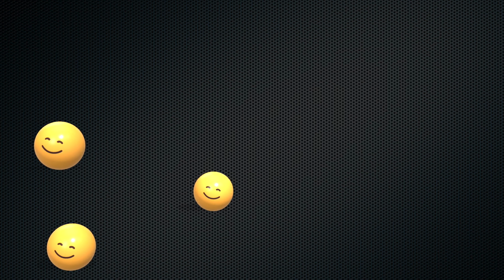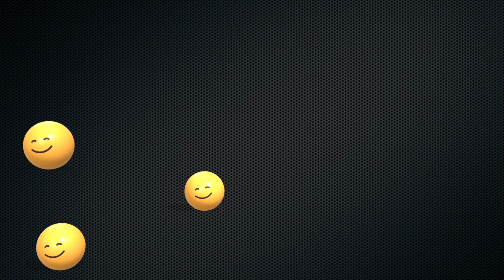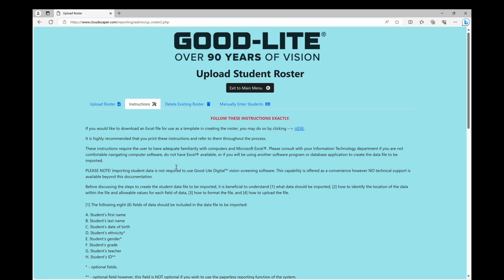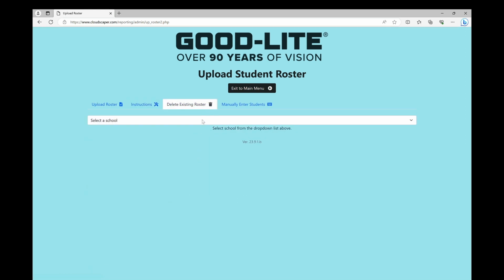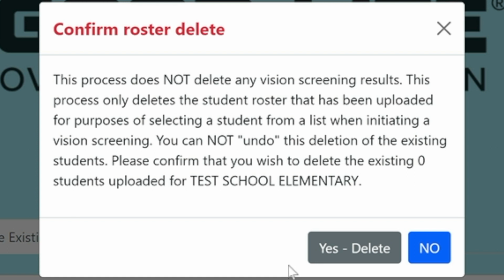Well, as you well know, not every student may get their vision screened. And as such, you may have students that are left over in this list. So, in general, we recommend clearing out the roster. Just click on the Delete Existing Roster tab, select the school, press the red Delete Roster for Selected School button, and then read the confirmatory message, and then press the Yes Delete button to confirm the deletion.